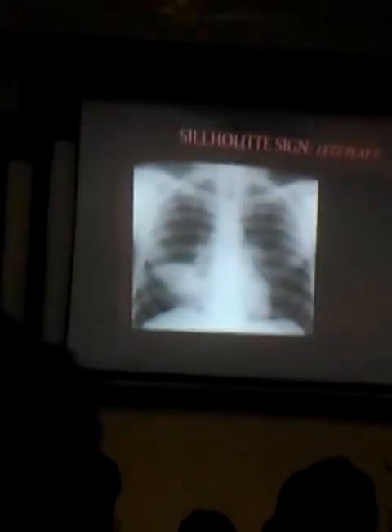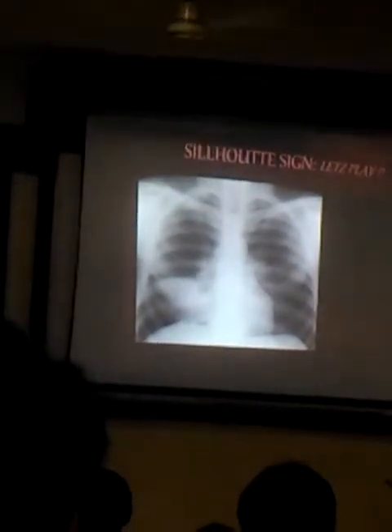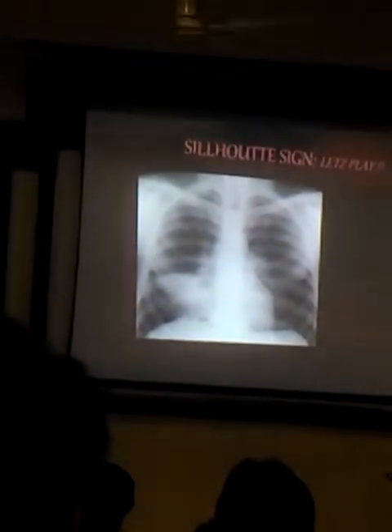No. The right heart border is not seen as a sharp margin. Where is the disease located? Right? Very good. This was the question in the recent AIIMS exam. But now I give you a challenge.